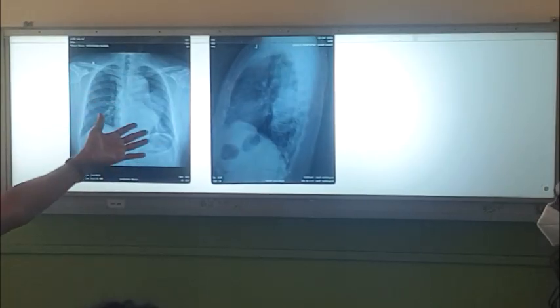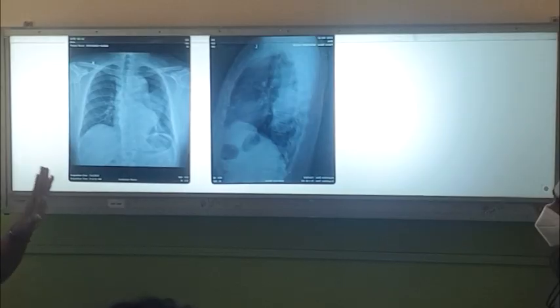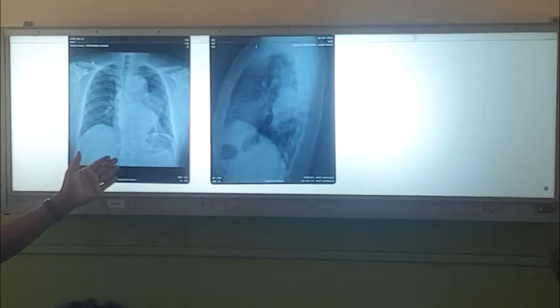And you take the history, this patient has come with interscapular pain, severe interscapular pain. So that is enough for you to suspect dissecting aortic aneurysm. So this is a patient with dissecting aorta. If you take the history, a few words, that is enough. Then you look for dissecting aneurysm here.